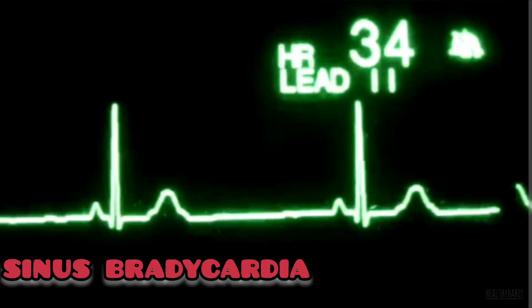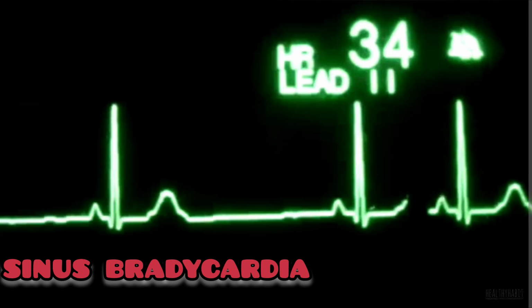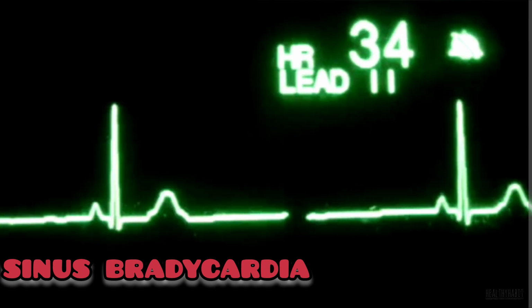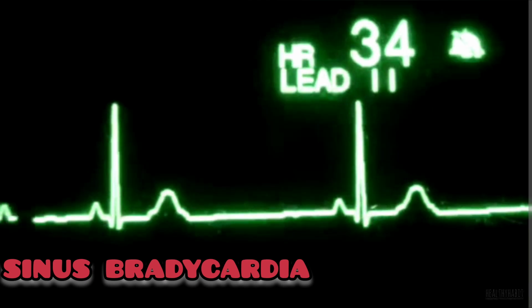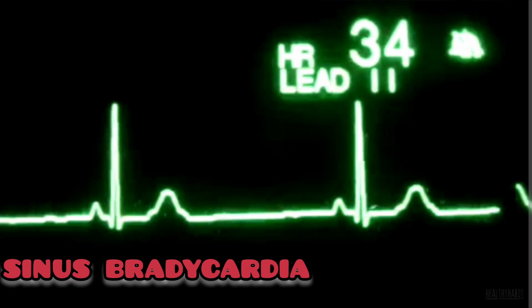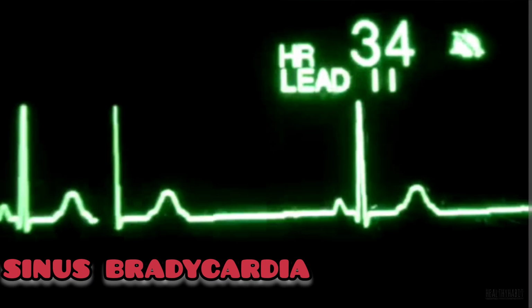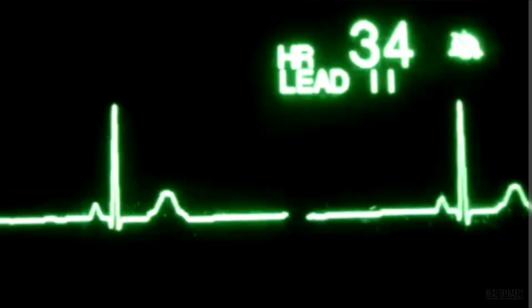Sinus bradycardia is a cardiac rhythm with appropriate cardiac muscular depolarization initiating from the sinus node and a rate of fewer than 60 beats per minute, BPM. The diagnosis of this condition requires an ECG showing a normal sinus rhythm at a rate lower than 60 BPM.